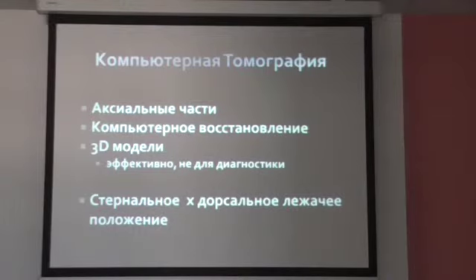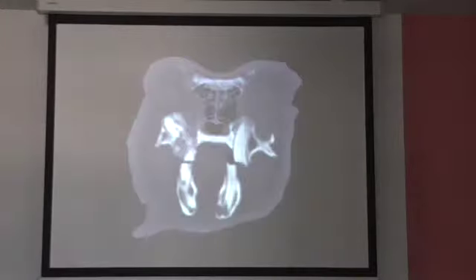But they are not 100% diagnostic. That's why we are using axial slices to assess the right problem in a rabbit. For rabbits I use axial slices, the axial method.